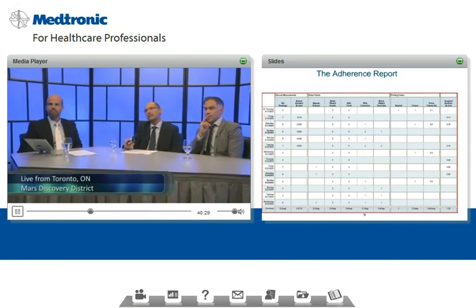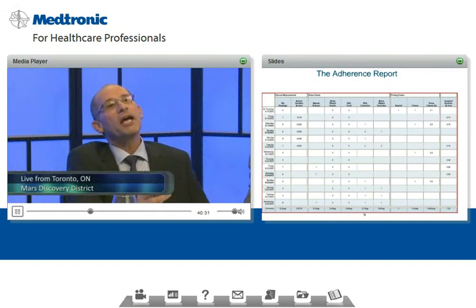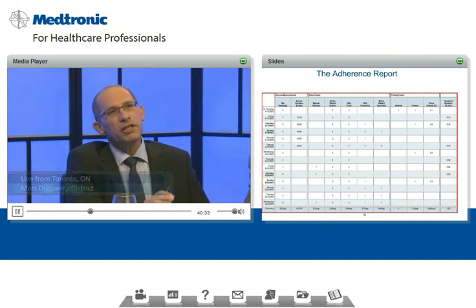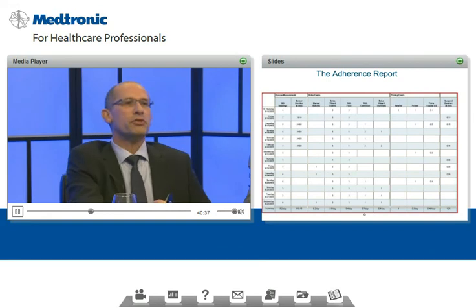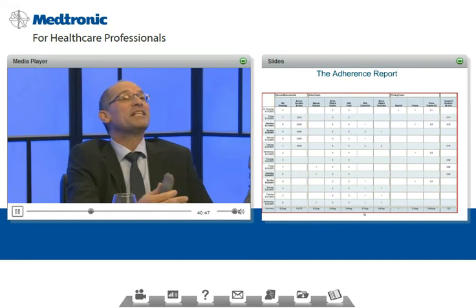Because it tells you exactly, is the patient using the boluses according to the plan? That means, is he counting carbohydrates? Is he measuring? Is he giving an exact bolus based on these two pieces of information? Or does he just do manual boluses?